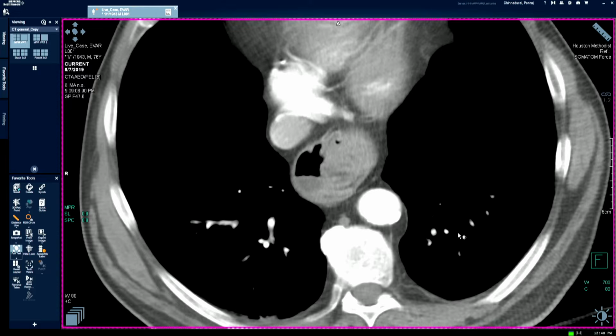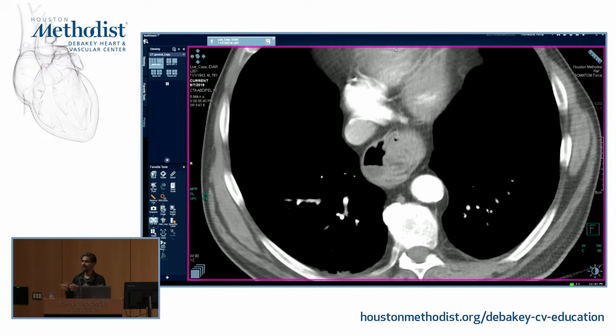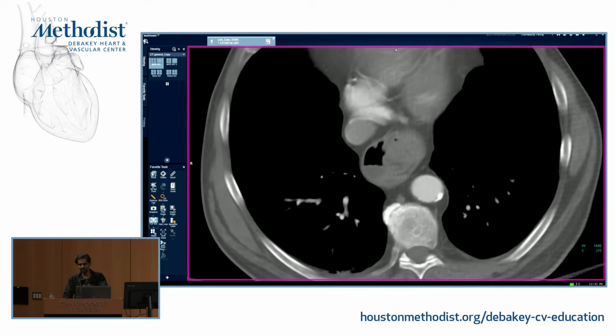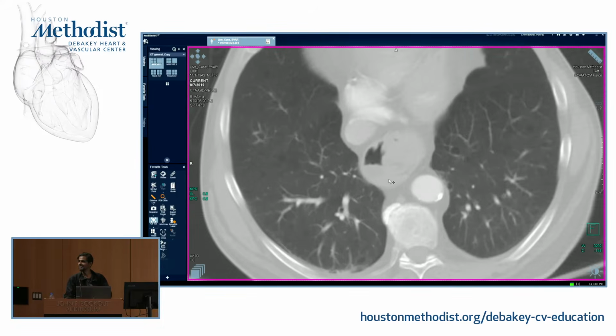Even geographically, the Hounsfield units can change. We can often get you close enough, but you often have to manually window it. That is one of the reasons I am teaching this: before you randomly go left, right, up, down, there is a method to this madness, and that's what I'm trying to show.